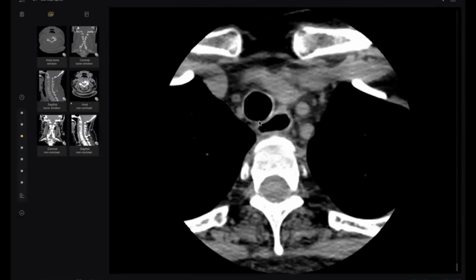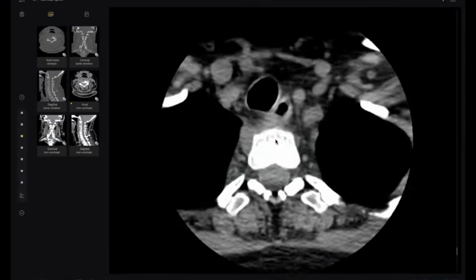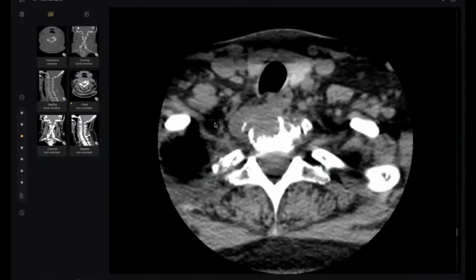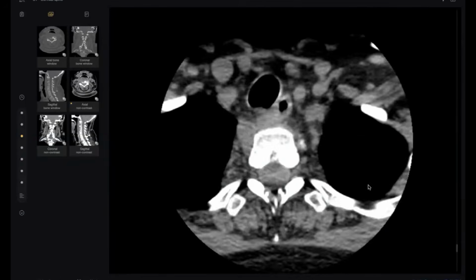and you should go down and ask him to change to the lung window, the first one, okay, to see any reticulation or any lung infection. And if you concentrate here, there is some infection here or some consolidation. There are some changes here in the apex. Here and here, there is pleural thickening or effusion, whatever.